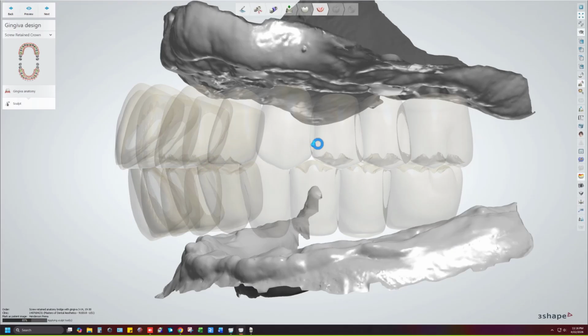it's computing. We did a lot of tissue work on this, and she was super happy with how the tissue pressure was. The guy was super happy. He's no longer having food trapped, and he's been wearing these for about 2 weeks right now. So, let's see. Again, it's processing pretty quick for a large case, but the better the computer, the faster it will process all this.